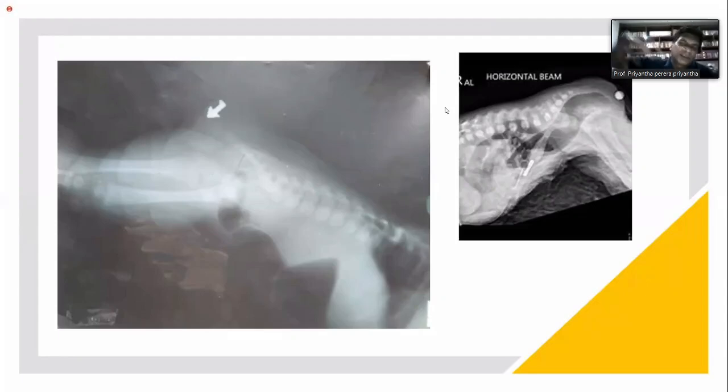And with the buttock somewhat in a higher position, so allow air to travel up the bowel, right? And then you keep a radio-opaque particle like the arrow or this round substance where the anus should be. Right? And then you take an X-ray, lateral view, horizontal beam laterally, right? And you see the distance between where the anus should have been and the upper end of the air column, right?